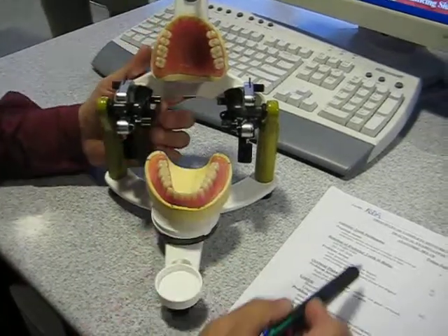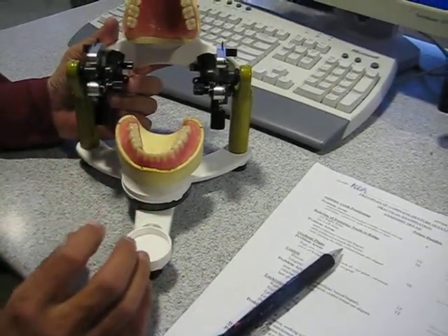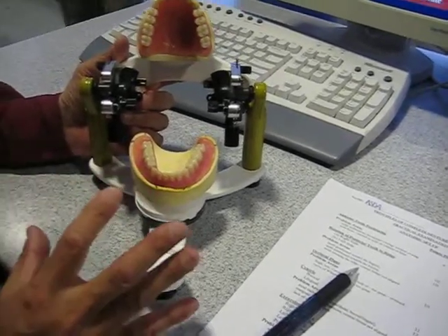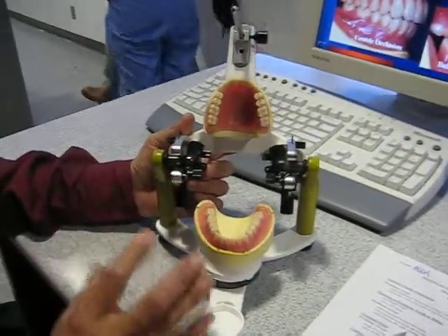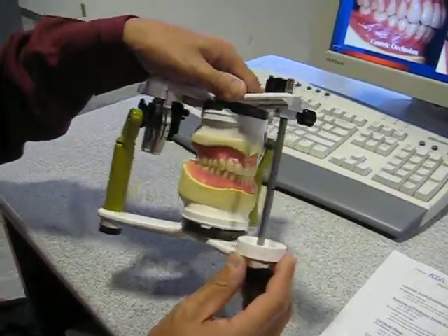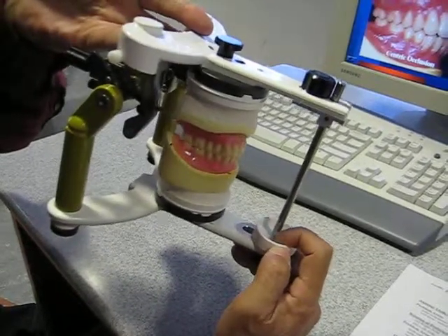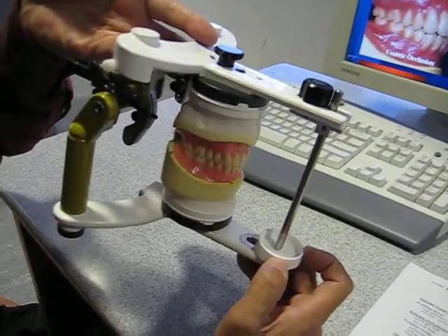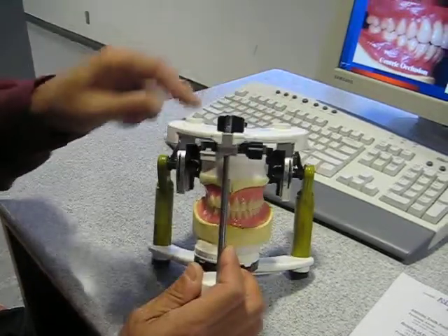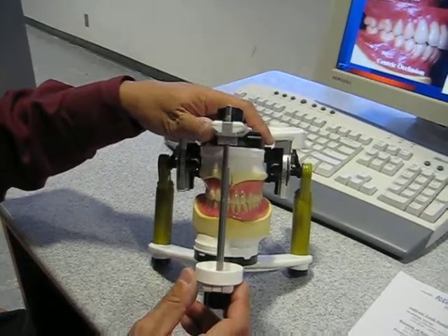One of the concerns in doing our grading is we start out by looking at very general things first. So we want to make sure that the skeletal relationship is correct, meaning that the vertical dimension has been maintained so that the incisal pin is still in contact with the incisal table, and that the pin setting is correct, and that's been maintained very well in this particular setup.